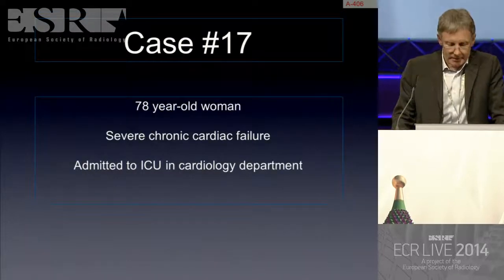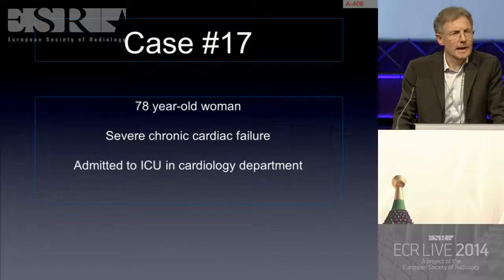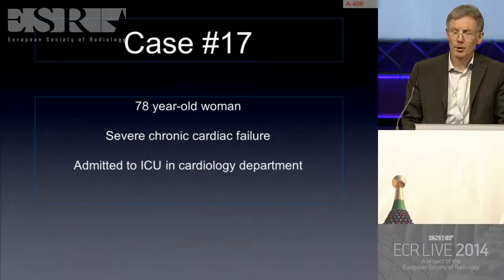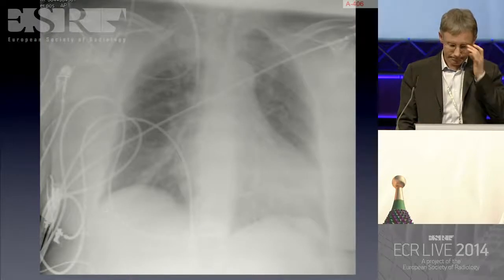Number 17 now. We have a 78-year-old woman with severe chronic cardiac failure. She was admitted to the intensive care unit of the cardiology department with this chest X-ray.